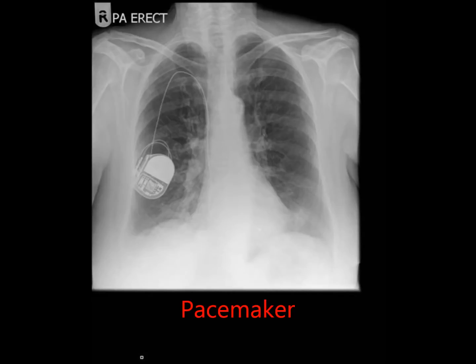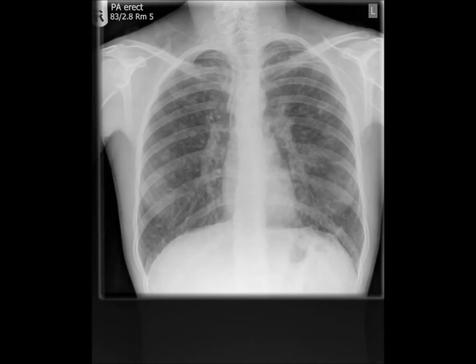Instruments refers to all those things doctors like to put onto or into patients. So we're talking pads, wires, cables, tubes, etc. Sometimes it's obvious what you're looking at, sometimes it's not. So if you don't know what it is, don't worry about it and don't spend too much time trying to figure it out.